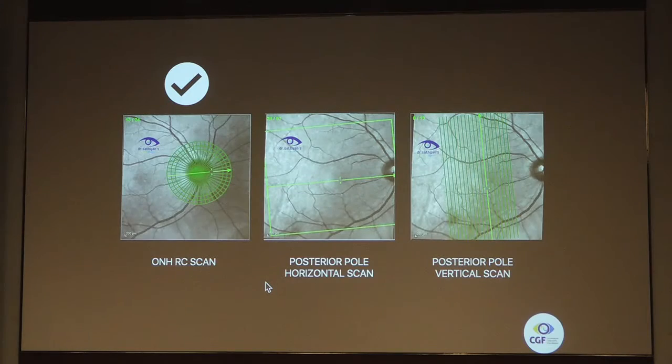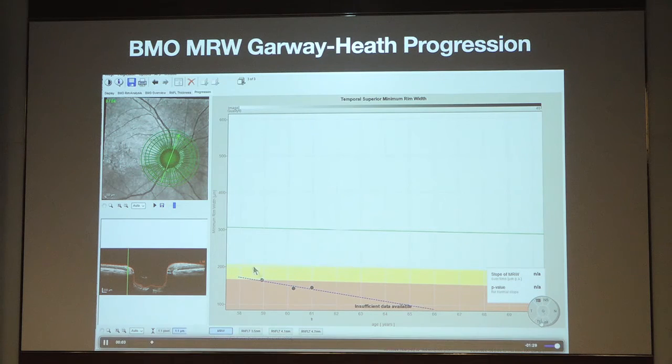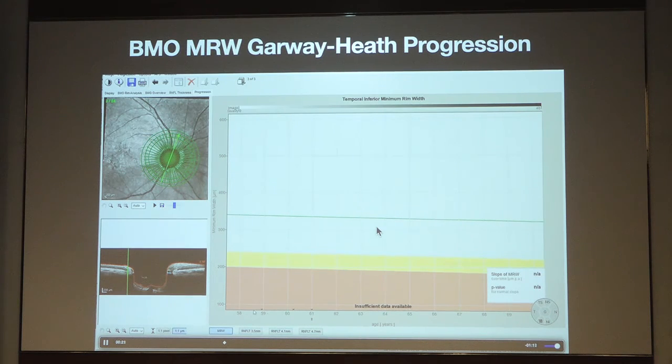The thickness, is it the same? Is it the same that is happening, or is there a change over a period of time? You can have multiple follow-ups and then you can see what the average thickness it is maintaining. That is a normal thickness. If it is something below, then you can understand, okay, there is a real defect which is happening. So it is easy for us to understand, but the reason why I am emphasizing is that in your system, when you have the printout, you cannot have so many printouts to understand how the progression is happening. Because each area you can click and then see what is happening in each zone.